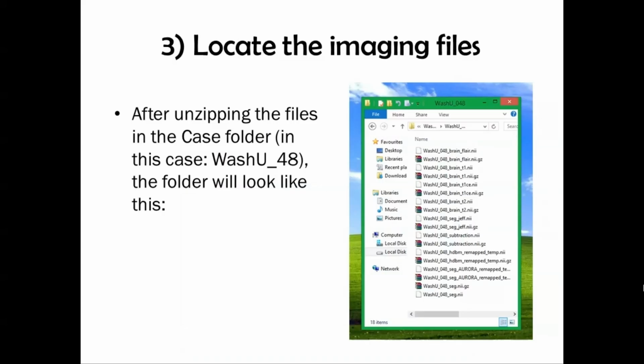The next step before segmenting is to load the images into ITK-SNAP. So you will receive folders with the cases, and for every case there is a zip file, and you have to unzip this file. After unzipping the files, your folder will look like this. So you will have the cases, and you have the segmentation files. We'll discuss that in a minute.